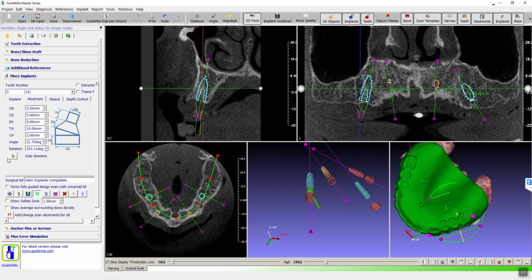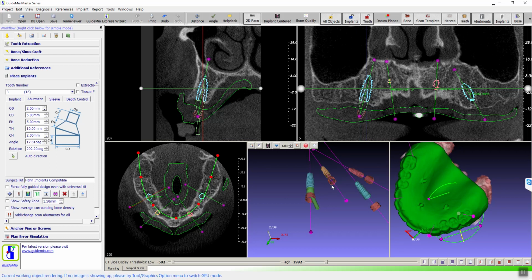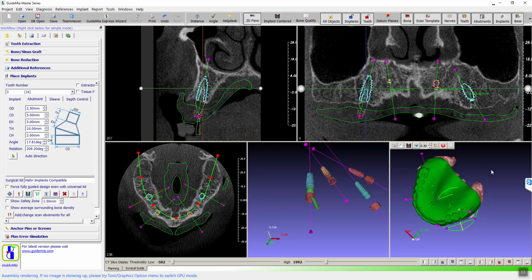Frank? Yeah. Hold on, we had a question from Dr. Manalili, and I have a question on the abutment work that you're doing there. The rectangle that you were just playing with across the whole arch, like the plane, to determine the angle of the multi-unit, you can do that on top of the radiographic guide, right? You mean this one? Yes, perfect. I just wanted to see that.